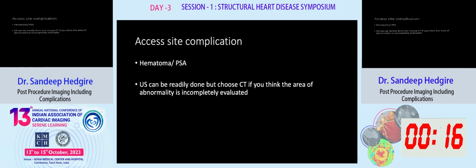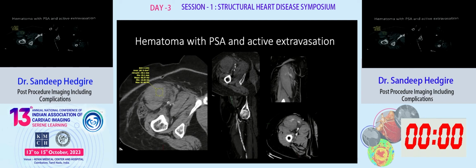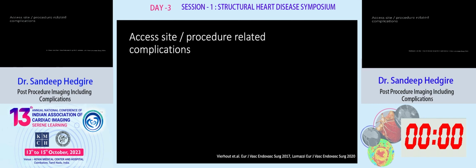Lastly, I wanted to mention access site complications like hematoma and pseudaneurysm. Ultrasound is a great test. Even a bedside ultrasound can diagnose a hematoma. If you find a pseudaneurysm, you can offer bedside compression of the neck of the pseudaneurysm, compress it and thrombose it. But sometimes it's not compressible, particularly in a large patient. Here are examples of pseudaneurysm, active extravasation, and a large hematoma.